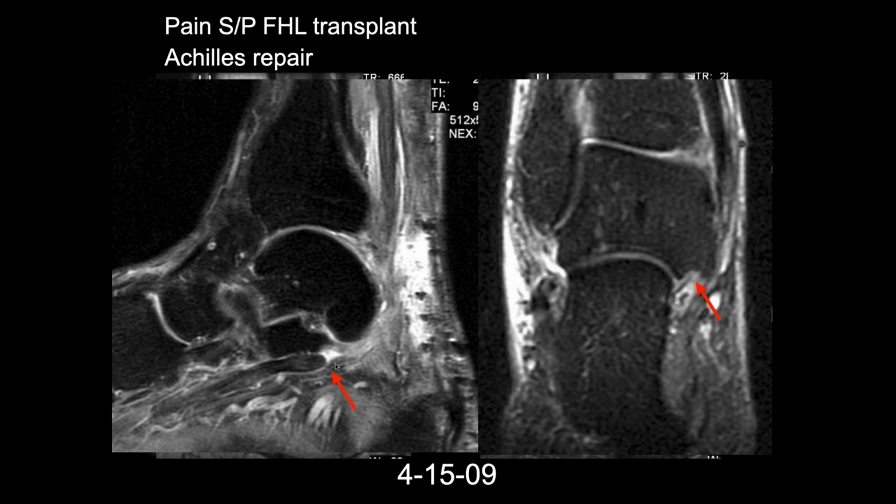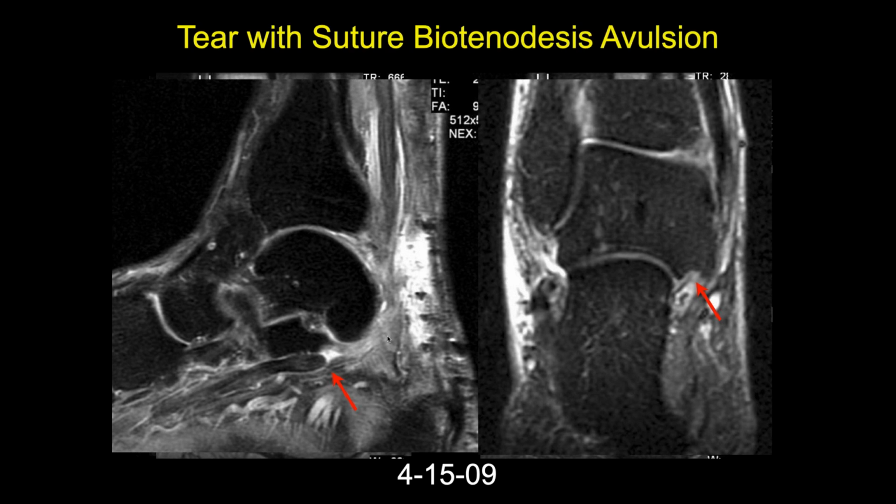It's torn there. Where's the Achilles tendon? Oh, I don't really see it. They then tore their flexor hallucis longus tendon. I don't think using that screw is a good idea. No, it wasn't in this case. So I'll show you some other examples of when John doesn't like to operate on these.